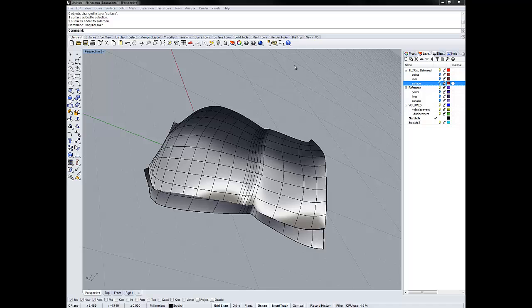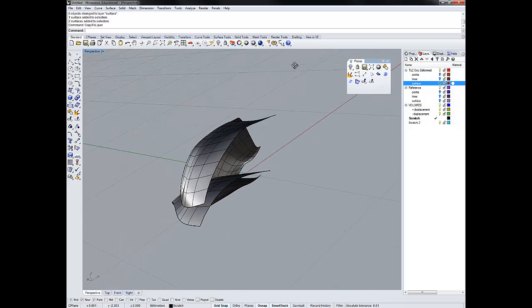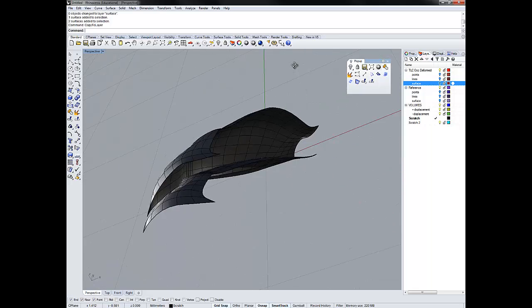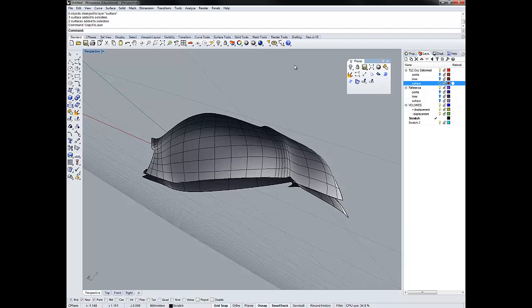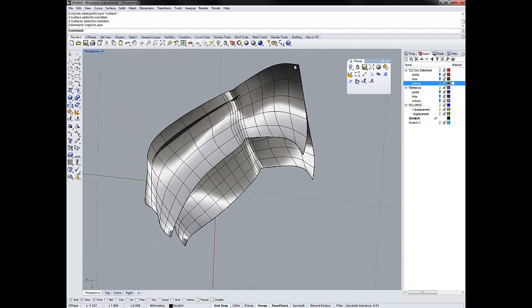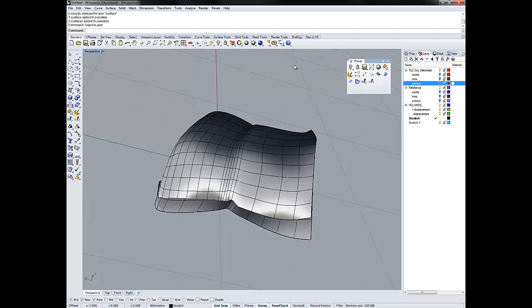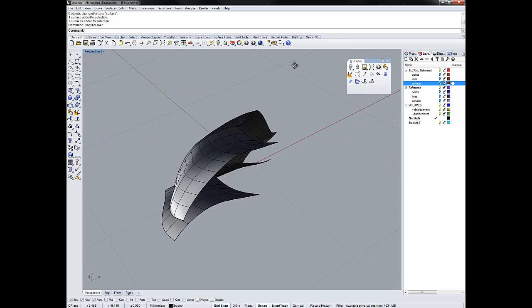So let's talk about the generation of volumes in a very top-level fashion. What we're going to end up with in the end of this entire procedure is this volume here being boxed off into separate parts. And the definition of separate parts is actually where these reference and deformed geometries overlap. So when they overlap slightly here, we're going to get a volume segment that's going to span this length. And where they overlap here, we're going to get a volume that spans this length.